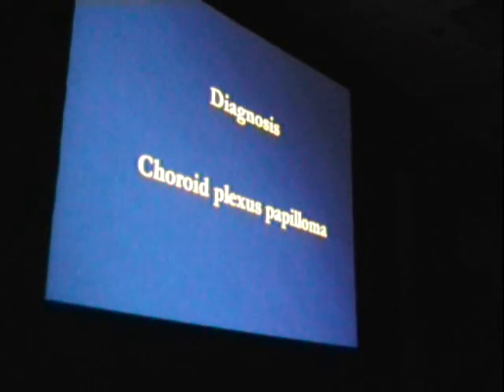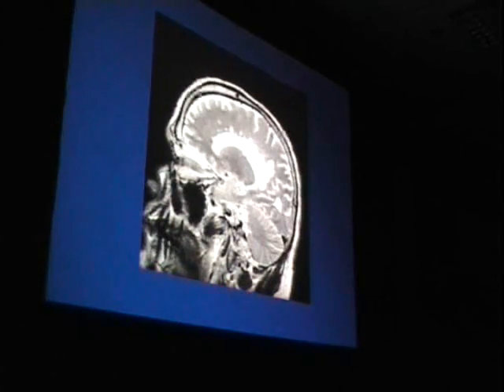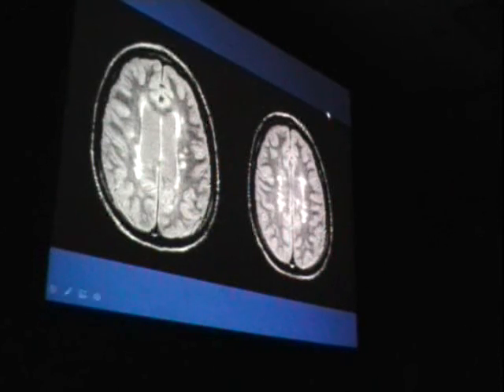Next, a particularly characteristic example of multiple sclerosis. This is a 40-year-old female patient with intermittent paresthesias. It was quite a reasonably straightforward diagnosis. We're just to one side of the corpus callosum, and you can see multiple foci of T2 hyperintensity paralleling the lateral ventricle, in an appearance typical of Dawson's fingers, seen in multiple sclerosis. This is again seen on the axial images here: the oval finger-like foci of T2 hyperintensity, which parallel the distribution of the periventricular veins.